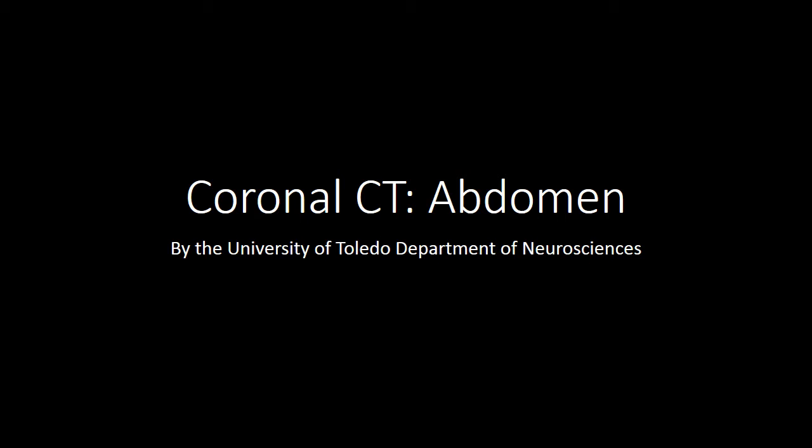I will be pointing out a few more arteries and veins in this video compared to the axial CT video. So please make sure to consult your lecture materials on those topics we are not covering here today, since they are high-yield written exam materials.